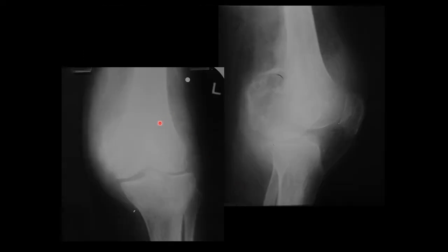Here's an example of a distal femur and proximal tibia. Left has been marked, so it's a left knee joint, and you can see this obvious lesion medially. We know this is medial because there's a fibula, so that's lateral. There's the medial femoral condyle, and posterior. Here we're looking at a lateral, so our posterior. So we know it's a posteromedial lesion of the distal femur. We know this is epiphyseal because it's right on the joint line, so the physis would have been about here, and this is distal to it, so it's epiphysis.